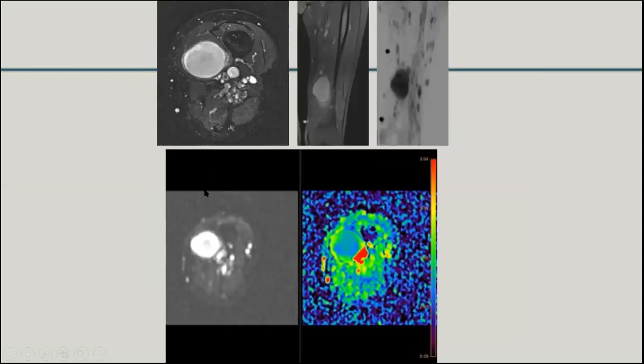Versus this kind of tumor, very hard to tell what's going on. Although you can pick out a tiny bit of peritumoral edema, that was it. So this was a grade 1 MPNST, and these become blue tumors like that.